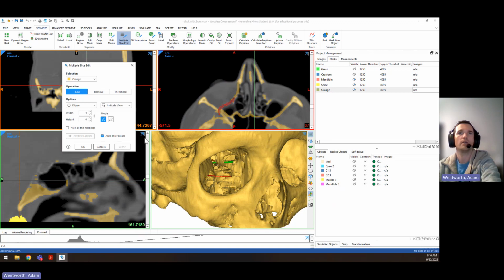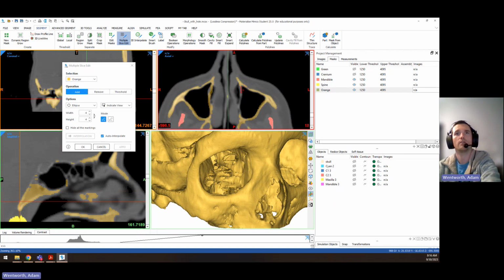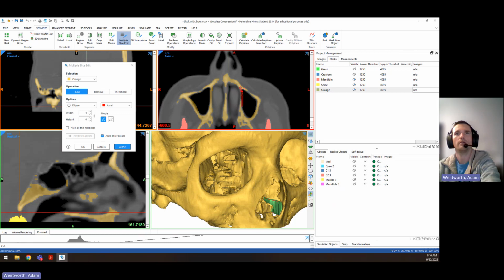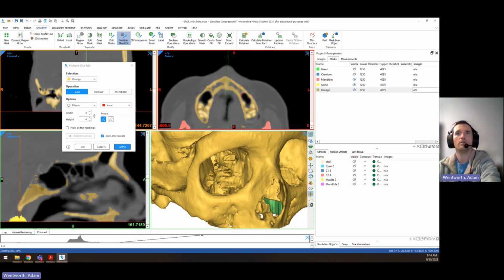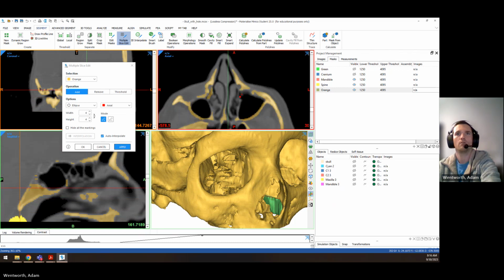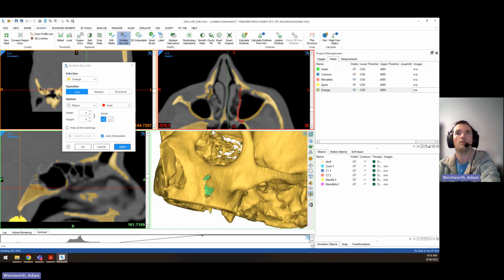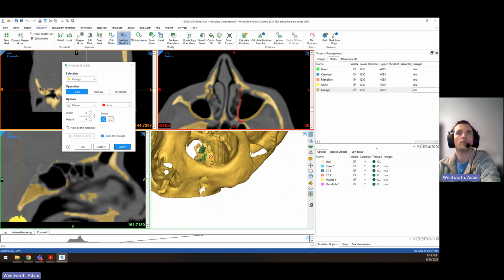So you can take a lot more time with filling in thin areas of bone around the orbits, around the maxillary sinuses like I'm doing here. And that'll help the skull be a much higher quality. So really, you should have thin wall all around this orbit.